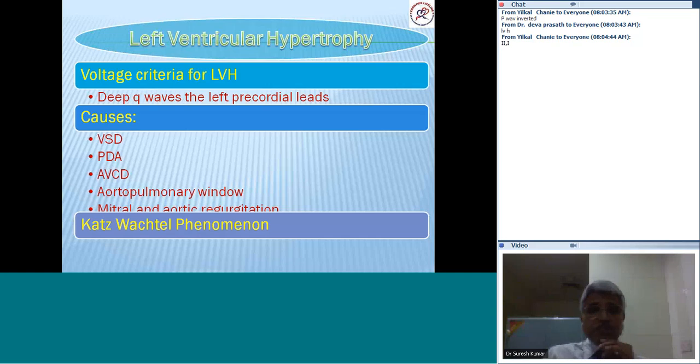You must also know what's the Katz-Wachtel phenomenon, which I'll show you as we go along, which means there is a biventricular hypertrophy.